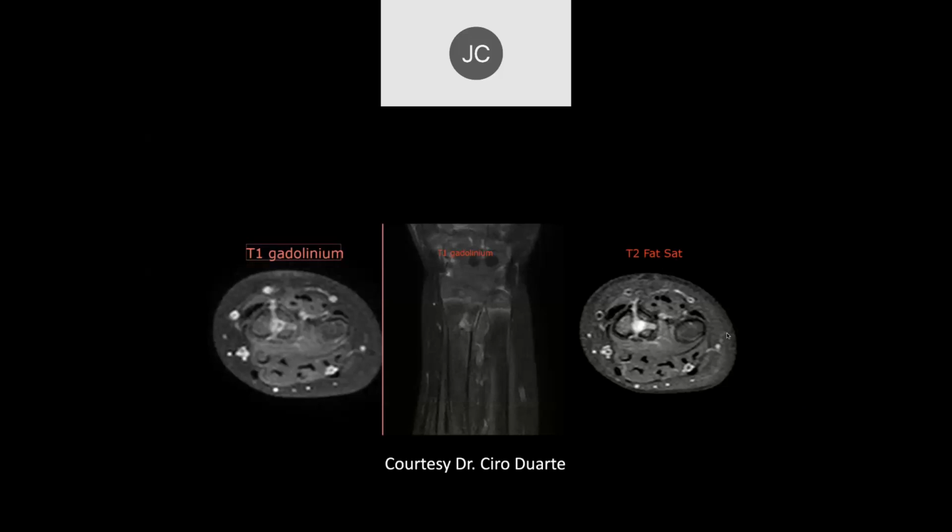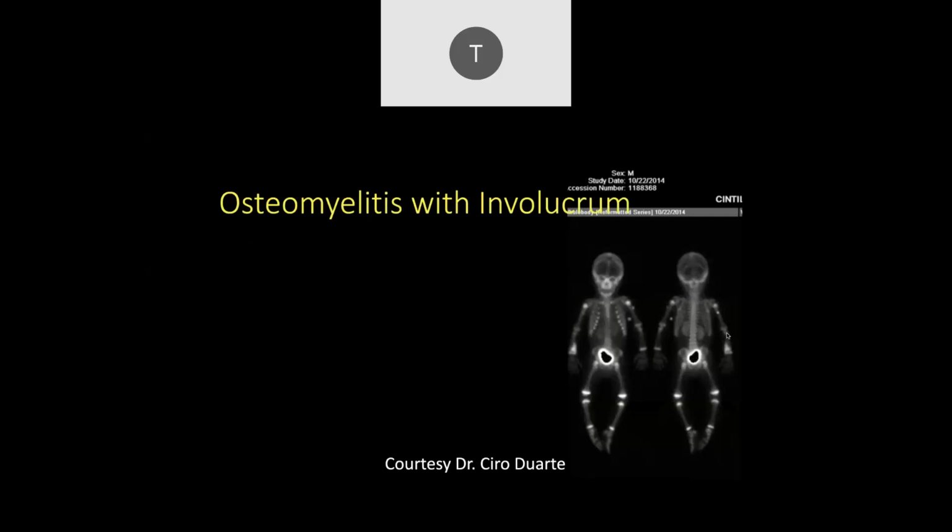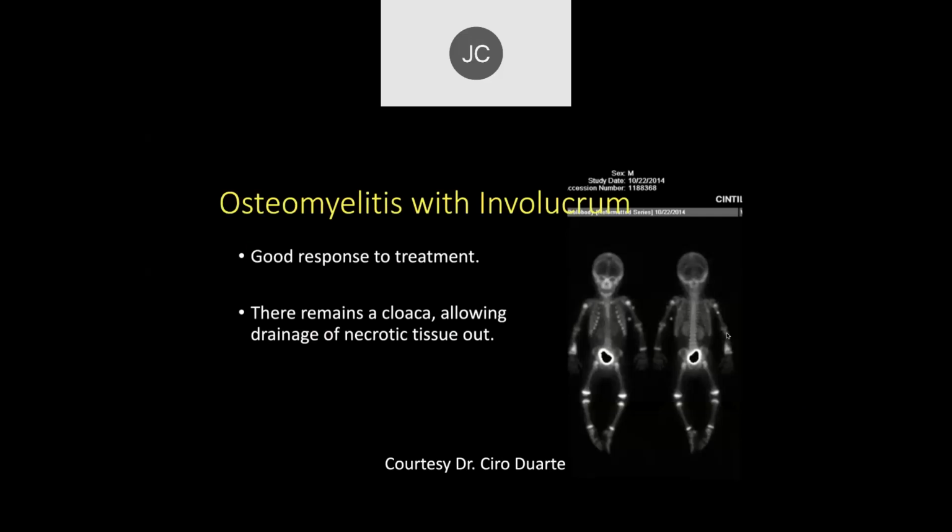Sequestrum, right. Good. And then the drainage, the sinus tract, technically, when it's infected, is called a cloaca. Okay.